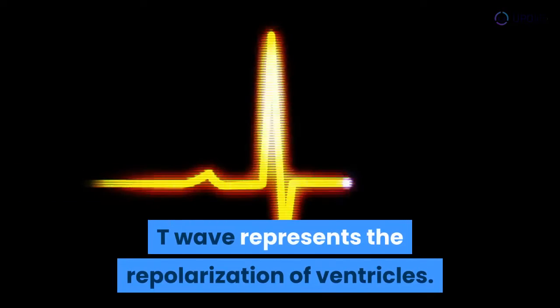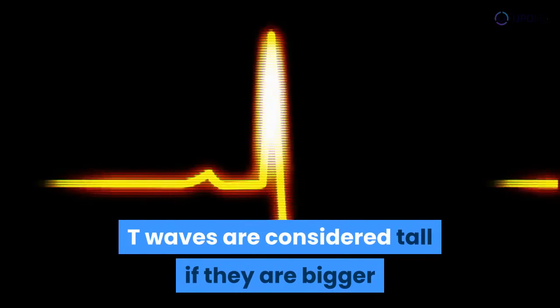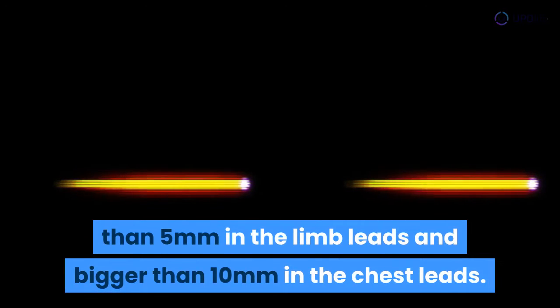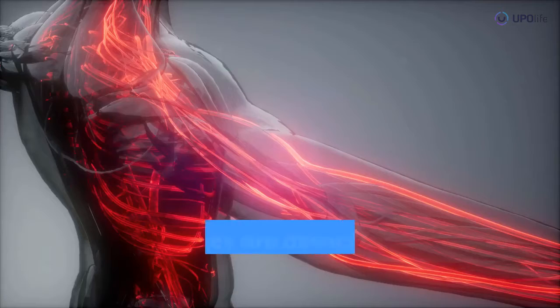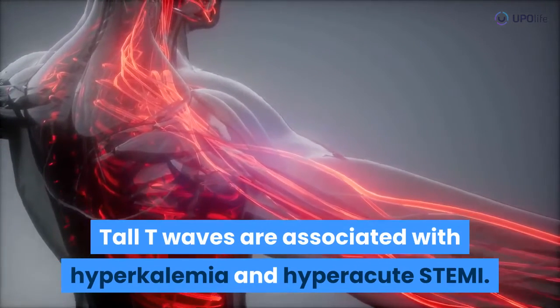The T wave represents the repolarization of the ventricles. T waves are considered tall if they are bigger than 5 mm in the limb leads and bigger than 10 mm in the chest leads. Tall T waves are associated with hyperkalemia and hyperacute STEMI.